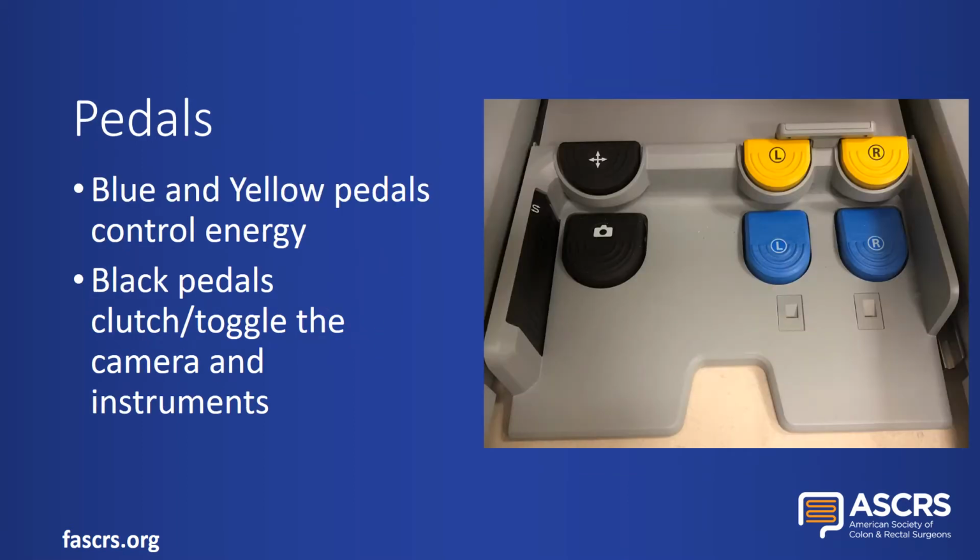The foot pedals control energy and other advanced instrument features, as well as toggling between instruments and control of the camera. The blue and yellow pedals are controlled by the right foot and activate the electrocautery attached to the instruments. These pedals can also control the seal and cut functions of the vessel sealer, as well as the clamp and fire functions of the stapler.